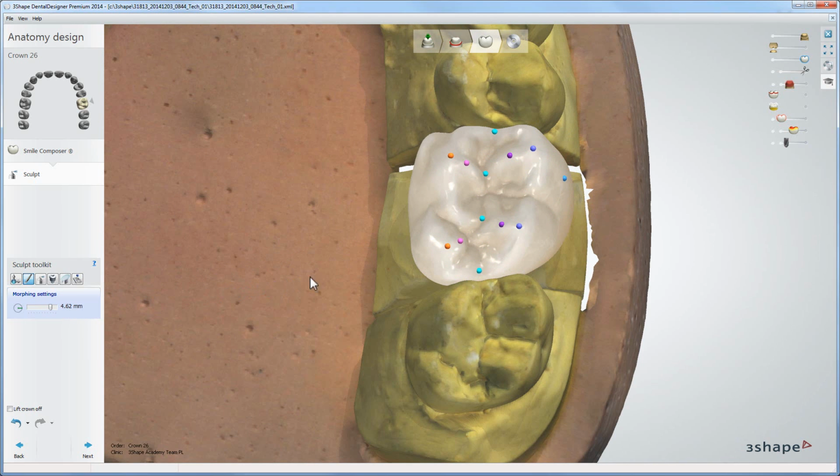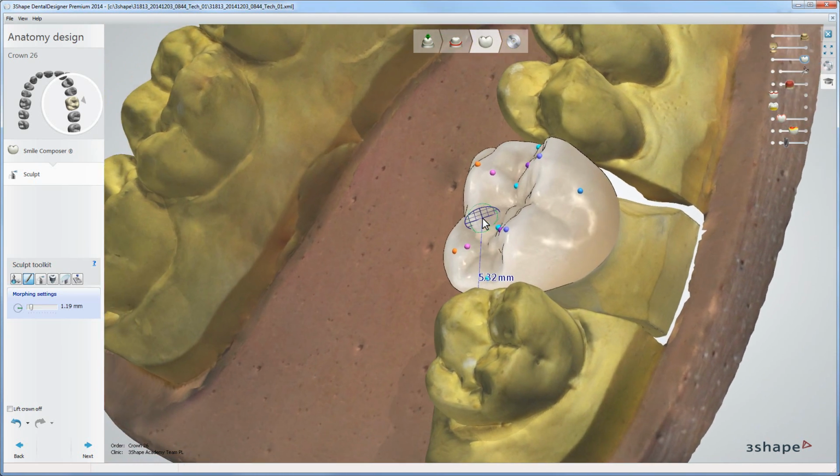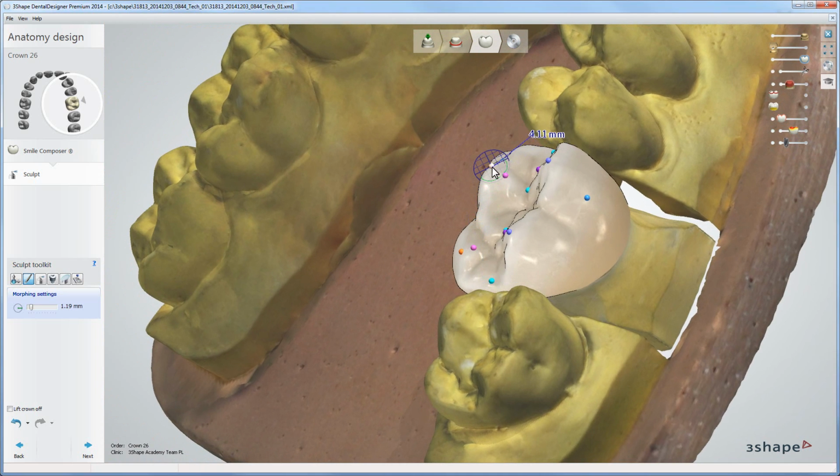Points are divided into different color groups, and you can drag them separately or press down Shift to move the entire control points group. Change the radius around the entire group by holding Shift and scrolling the mouse wheel. Hold Control button and move your mouse up and down to move the chosen point along one line. Hold Alt and left-click to add or remove control points.